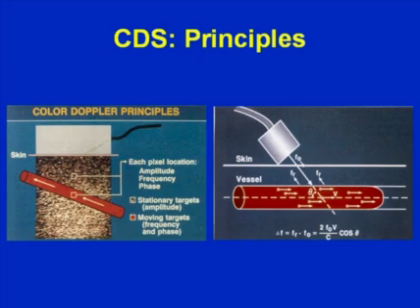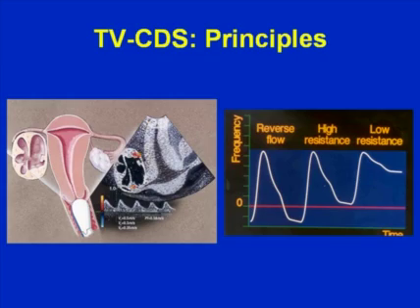presentation. Now, color Doppler depends highly on the angle at which we examine the vessel, and I would say not only does the amplitude of flow in the vessel count in its depiction, but the angle at which it's interrogated has a very important role in its depiction.